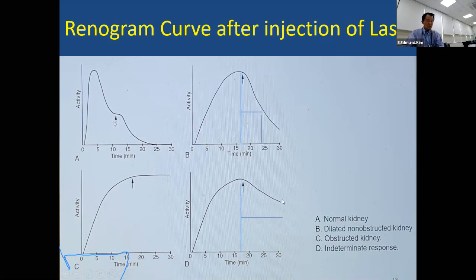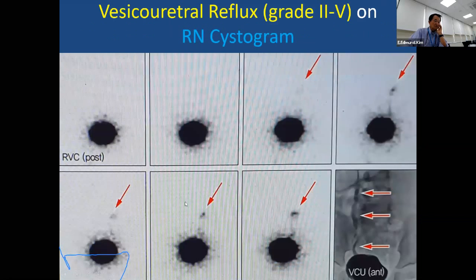So in functional obstruction, you usually use hydration and Lasix for the treatment. But any mechanical obstruction needs surgery or nephrostomy or retrograde. Urologists usually look at a retrograde study and then make a decision. So this is vesicoureteral reflux in pediatric patients. As you can see here, you can have a grade, depending on what you see in the ureter or kidneys.